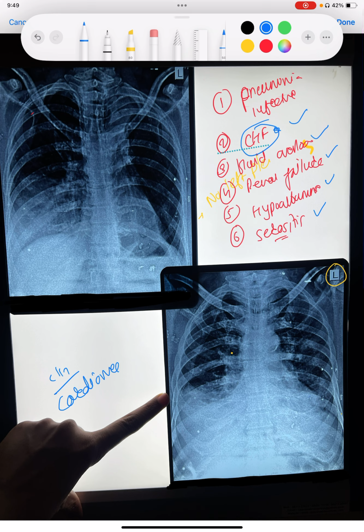Also, whenever we have renal failure because of chronic kidney disease, those patients also very commonly have chronic heart failure. So, in chronic heart failure or congestive heart failure or chronic renal failure or CKD, usually the heart shadow will appear large. In this, we can very easily see the heart shadow is appearing so large.